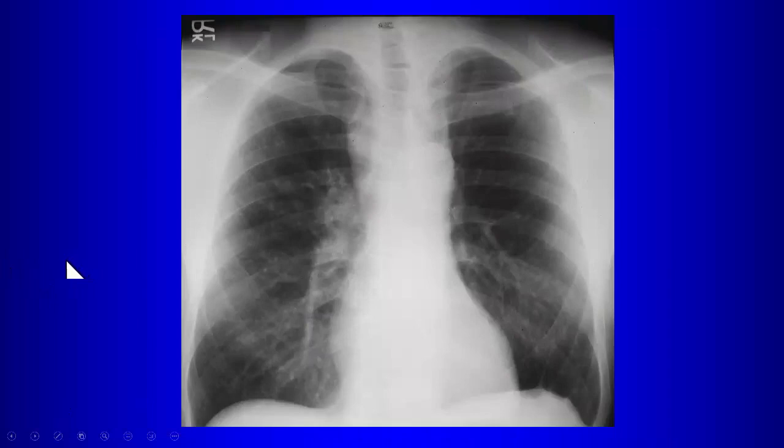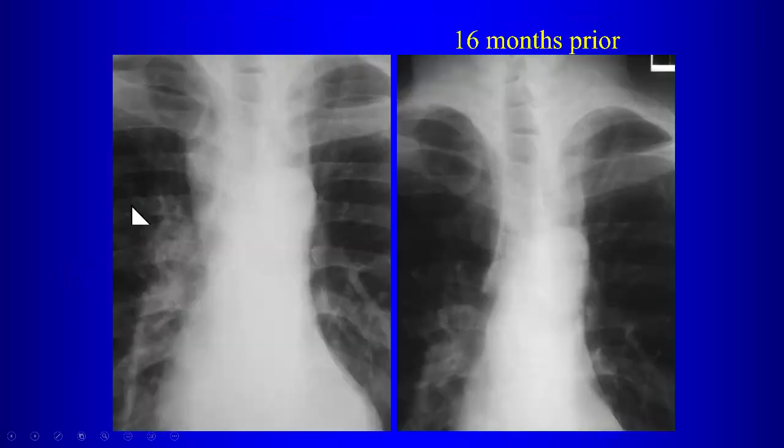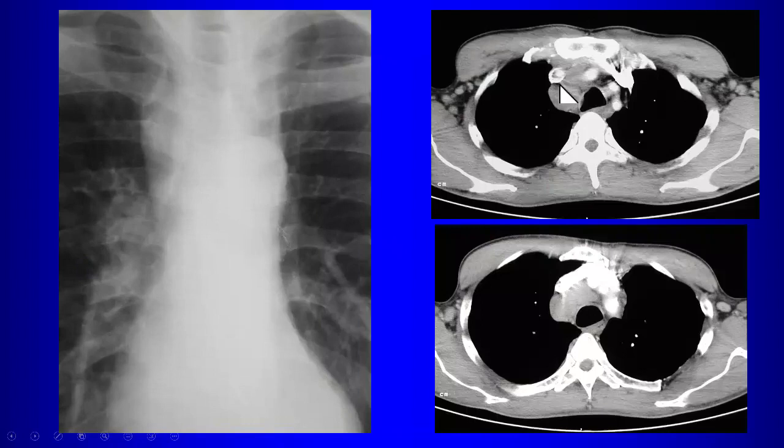Here, when you look at this chest radiograph, right, you might wonder a little bit. I don't see a good right paratracheal line. There seems to be some increased density there. And again, now you go back and you look at the old film, and can you appreciate the difference? Yeah, you can. You can really see a nice right paratracheal line here, but now it looks like there's all this added opacity there in the right paratracheal region. That's lymphadenopathy, as it turns out. Right? This is right paratracheal lymphadenopathy.